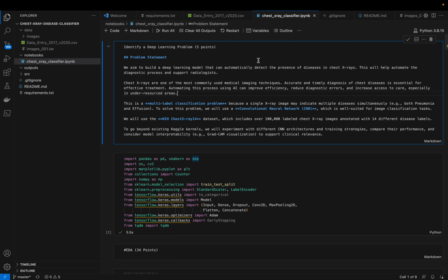to basically analyze. We have a bunch of chest x-ray data, and we have these images, and what we want to do is make predictions and categorize, starting with analyzing the data set from the source, which is the NIH. It contains images, different diagnostic labels, patient metadata, and medical imaging. I left the link in the GitHub repo. You guys can check that out. But let's walk through exactly how we did it. So again, the overall goal is to predict and detect different diseases in chest x-rays.